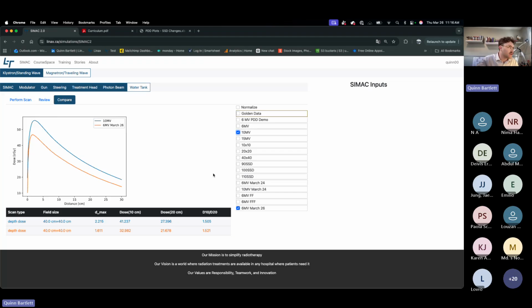That's very hard to see here in the slower fall off, but if we normalize, then we can see them together. You could maybe just see that the orange is going to fall off a little bit quicker than the blue. The blue is going to start to plateau out a little bit, where the orange is going to keep going at a steeper slope.